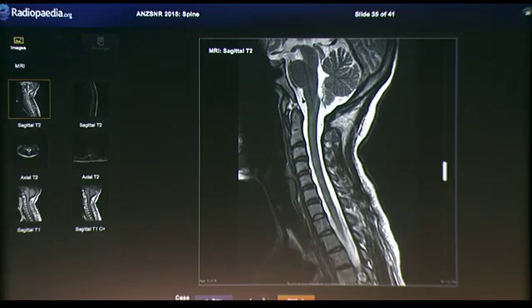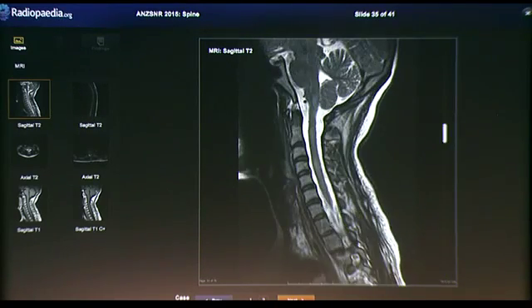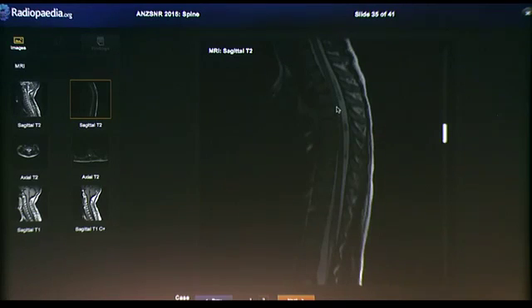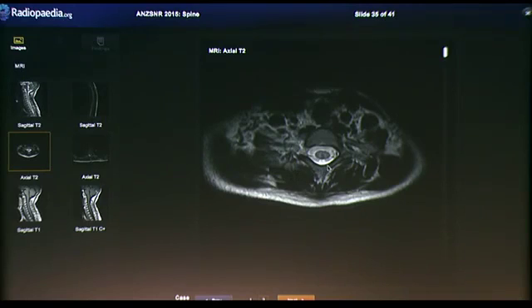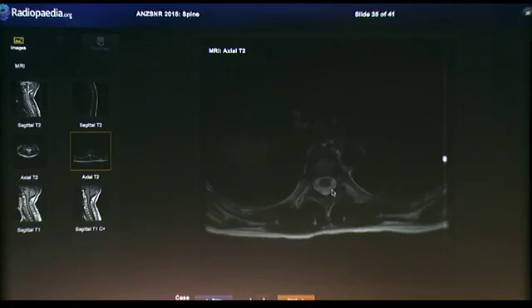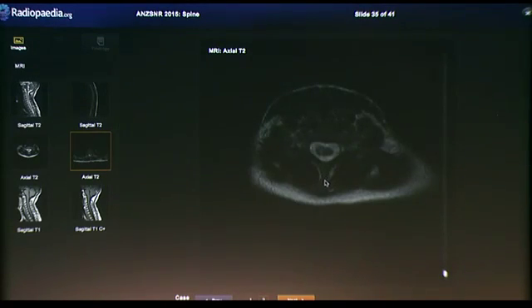So we have a look at the imaging. And we've got long segment T2 hyperintensity, cervical as well as thoracic cord. On the T2 sequences, in some areas we've got kind of patchy asymmetric signal abnormality, but most of it is fairly central grey matter predominant. So really quite a non-specific appearance. It's that real transverse myelitis look.